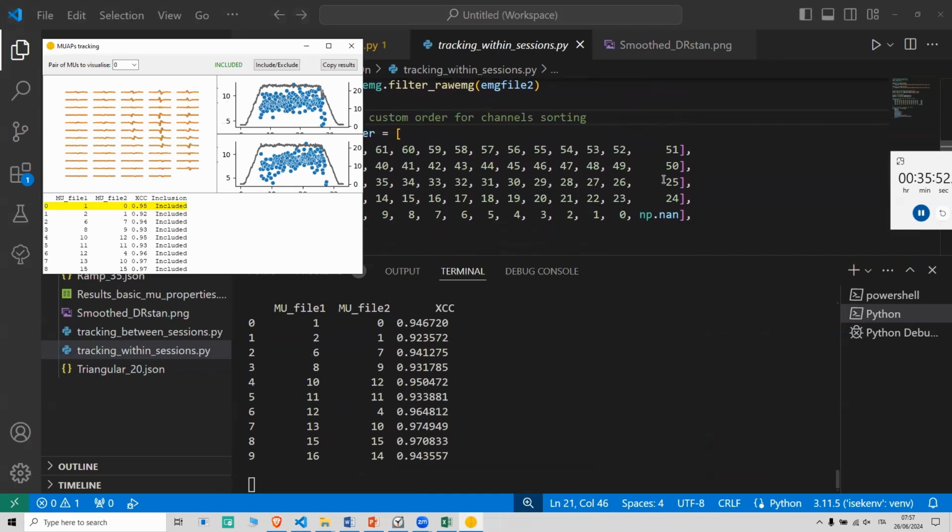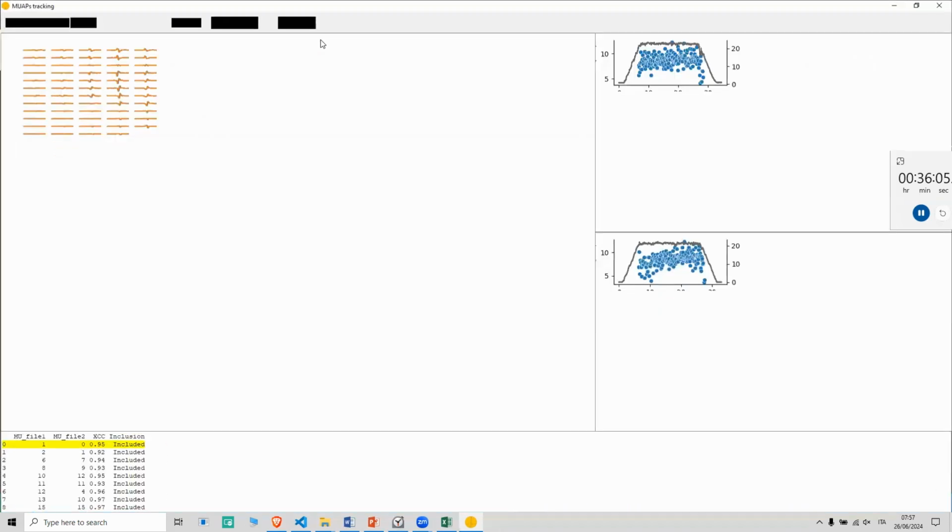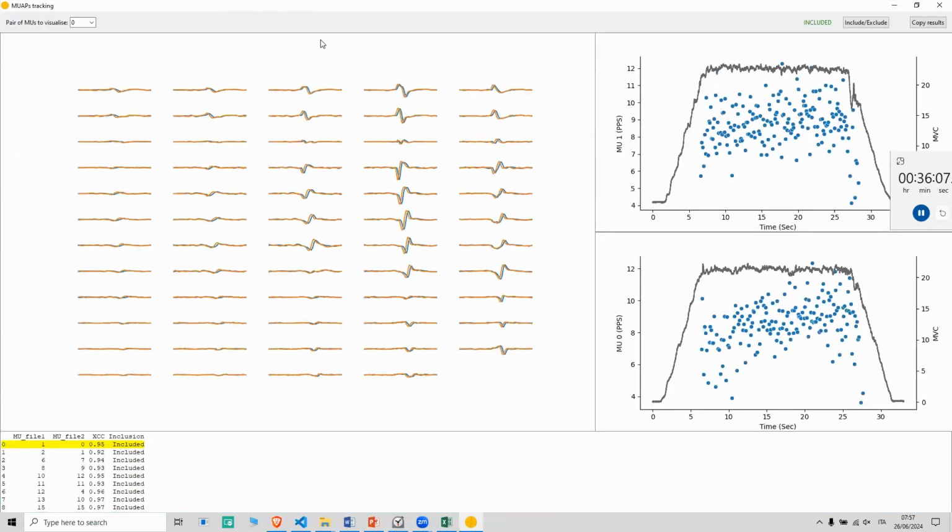And after doing that arrangement of the electrogrid, which is very important, then of course you will do the cross-correlation matching. One important thing, because I know that sometimes in certain sessions you might miss some channels, okay? It's important to remove channels, for example, if you have missing channels, because that can, of course, affect the cross-correlation measures.